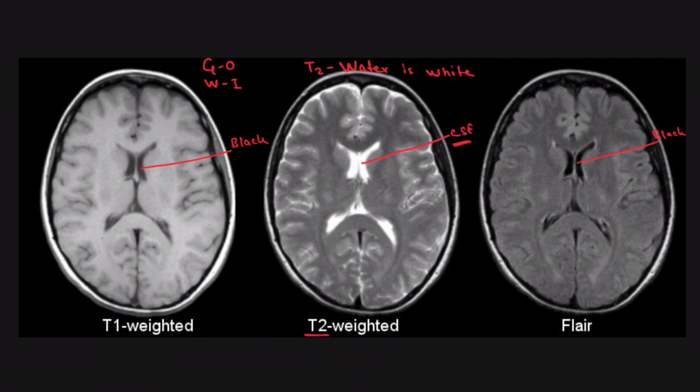As you know, the gray matter is outside and white matter is inside. So you can see in this image, this part I am marking. You can differentiate between the colors of these two. This is hyperintense, so this is white, this is hypointense, this is gray.